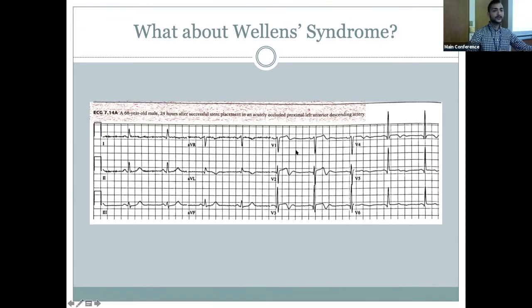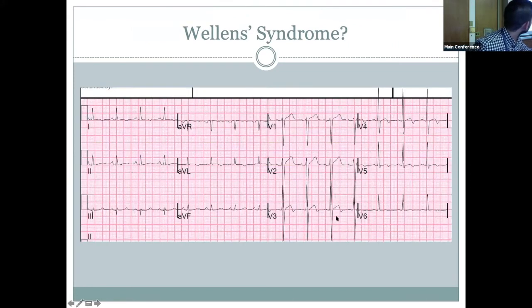This is a patient who had this EKG 24 hours after a successful stent placement. And so I think it illustrates how important it is to keep in mind the clinical context, and that Wellens waves are just a marker of reperfusion. So that's what I wanted to illustrate with this EKG. What about this EKG? Is this Wellens syndrome?